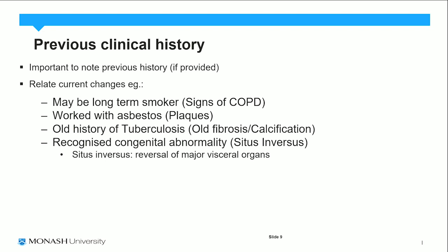It's important to check whether the patient has had previous x-rays done, so look at previous notes or previous history, as this can relate to current changes that you see on the chest x-ray.